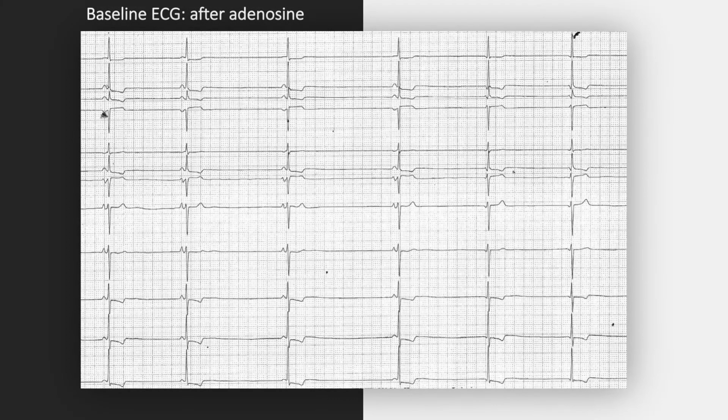After adenosine administration, there was no widening of the QRS complex. The initial part of the adenosine testing showed a sinus bradycardia with already described QRS complex. After the fourth complex, however, the patient developed an AV junctional escape rhythm where the septal Q wave in the left lateral leads reappeared. Based on this, we made a diagnosis of an accessory pathway, and the EPS study localized it to the parahisian region.